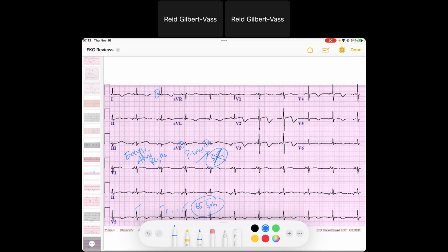It doesn't know if it receives signal from the sinus node or from an ectopic beat. And so we still have narrow QRSs throughout. Our QRSs are isoelectric in AVF and they're up in one, so they're probably right at about 0 degrees for our axis, which is normal. And maybe a little bit of premature R wave progression, that's not a big deal.